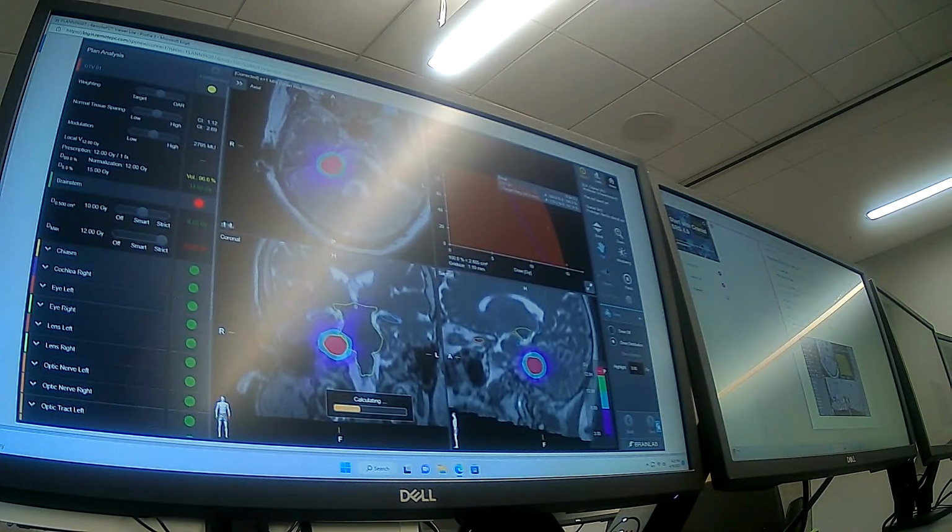All green, all green. And Trish said go to 4 arcs, so I did. And now I can't get back to the all greens. Yeah, I'm too blue. That's figured out. Takes a little while.